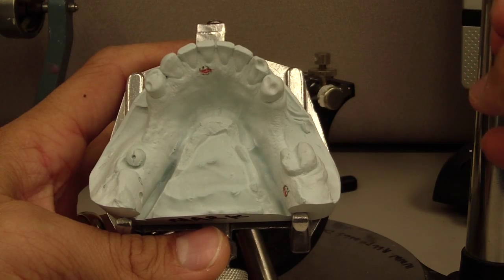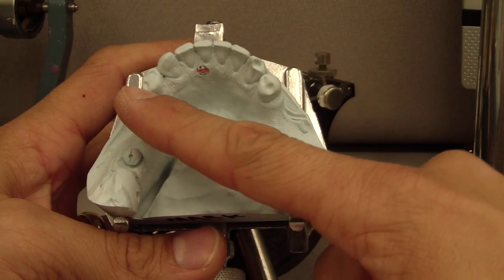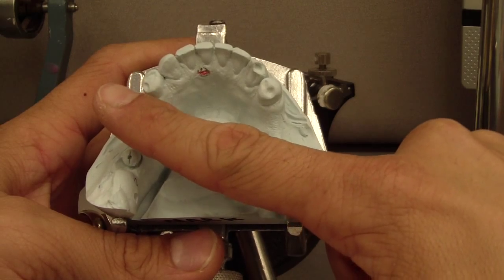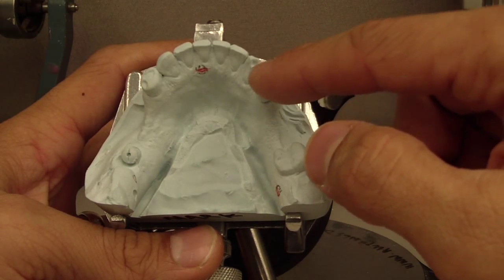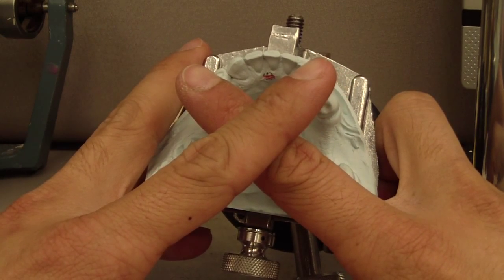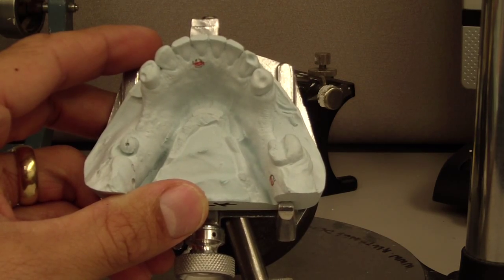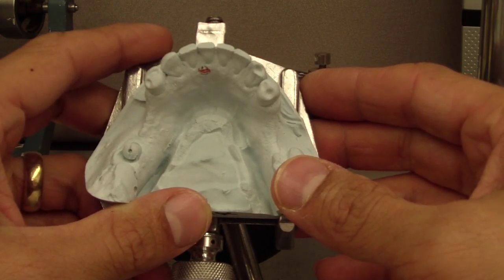Now, we don't have an indirect retainer because the fulcrum is actually the most distal rest on each side, so that being on the premolar this rest seat, and on the right side this rest seat here, this is the fulcrum line. However, I have a rest seat here, so the indirect retainer, which would be perpendicular, like that, is only going to be approximately 4 to 5 millimeters mesial to that. I mean, you could put one in there, but the amount of indirect retention you're going to gain from 4 to 5 millimeters, we discussed this at length, is going to be quite minimal.